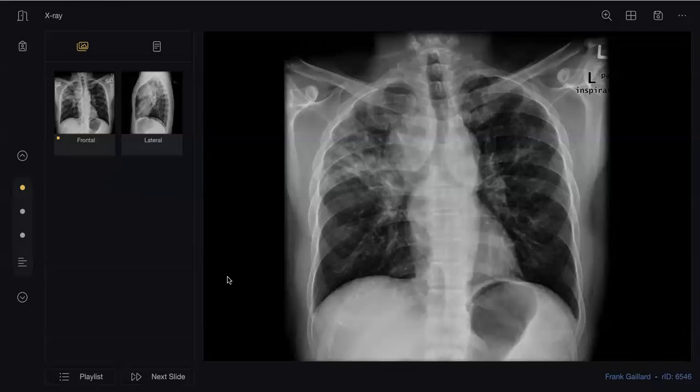While I'm looking at the heart, I can appreciate that there's a retrocardiac opacity of similar density as the right paratracheal region. The superior aspect of the trachea is identified, whereas the background vertebrae are normal, and the hemidiaphragms and the surrounding bones are normal as well. So this appears to be an infiltrate. It could be an infective etiology in the lung with lymphadenopathy.